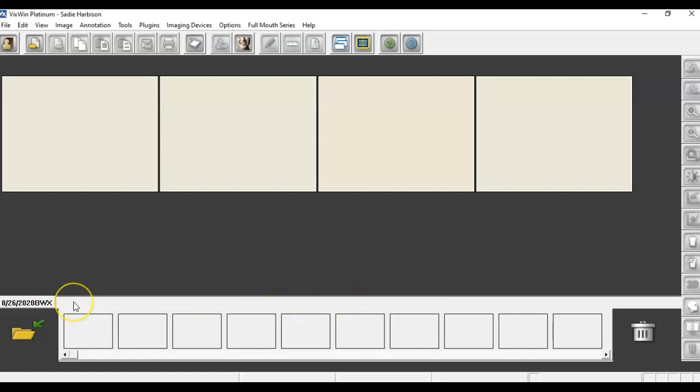So it might say 9/18 FMX, whatever, just all these different dates. And then they can click the tabs to see the films, but they don't have to click the tabs to find out what the films are. They already know what they are. There's a pano, though, it'll say 7/16 pano or whatever.